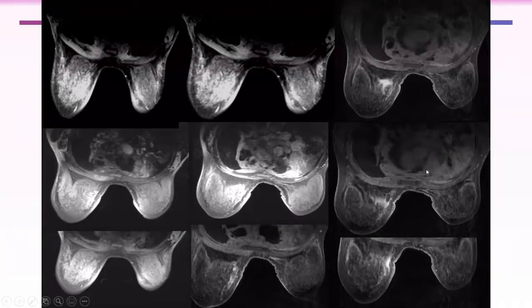Usually you have seen what behind the breast? Heart. Is it a normal heart? And surrounding the heart is? The pericardium is thickened also. Thickened and heterogeneously enhanced pericardium, yes, as well as the left pleura. You see, there is mild pleural thickening on the right, while extensive on the left side.